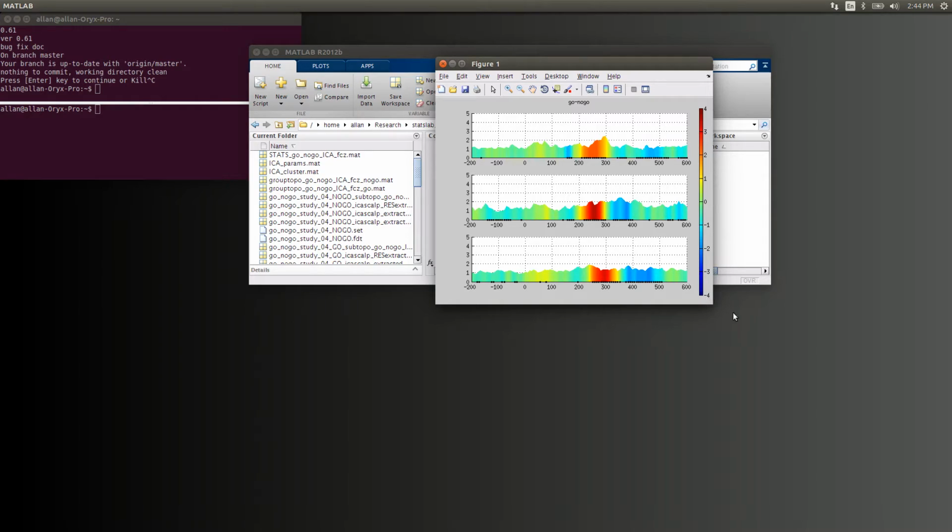Okay, and the reason I have this, and there's a number of visualizations you can use for single subjects, is because if you have, say, 30 subjects in your study, plotting it with the wave option like we did before, it's not very clear when you have that many subjects. With the waves, you can't see the effects quite as clearly. So this is a good alternative to that, and there are others.